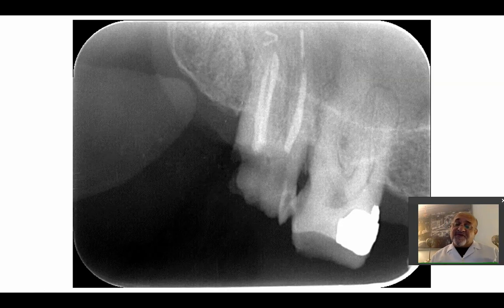And now we're moving more posteriorly. In the posterior surface, see, this is the floor of the sinus. Over here, roots, mesiobuccal, palatal, distobuccal, and there is a continuous surface of the maxillary sinus. See the bone trabeculae over here, and this is the maxillary tuberosity. Now, you often see this with radiographs of the posterior teeth, especially if you extend the film too much backwards towards the distal or the maxillary tuberosity.